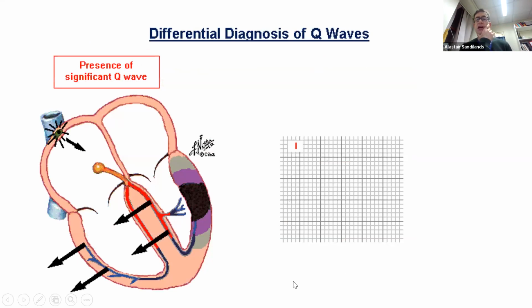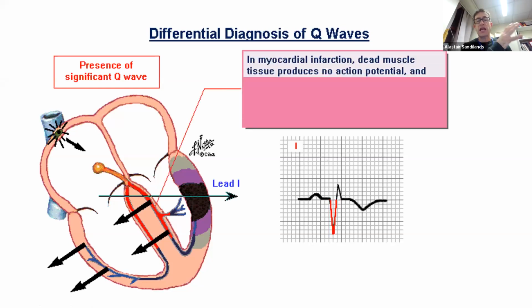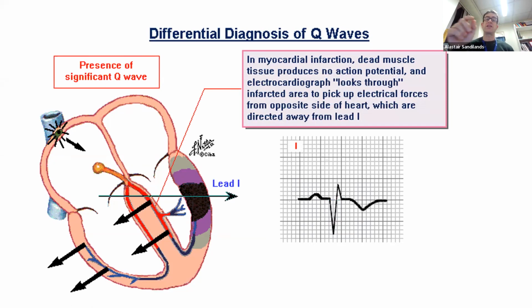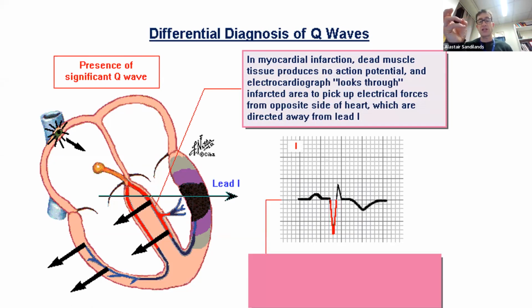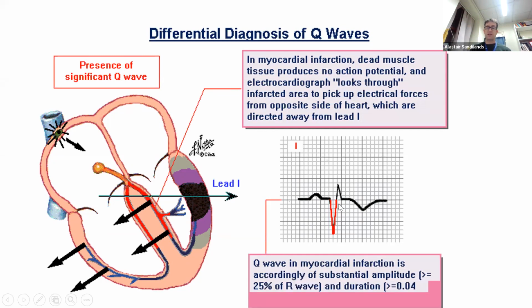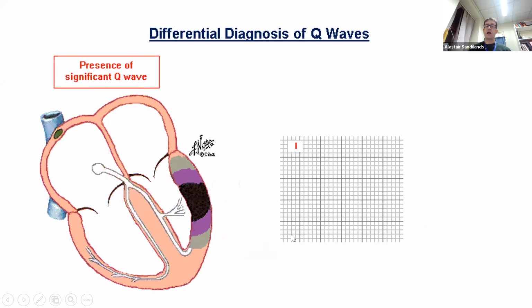So the other thing we're looking at is Q waves. And again, most of the Q waves should be in a region of a coronary artery in the same way that there would be ST elevation. If the myocardial infarction was untreated, then the muscle would be damaged and would show signs of a Q wave. So what we expect is a negative deflection that's greater than 40 milliseconds and at least greater than 25% of the whole R wave.